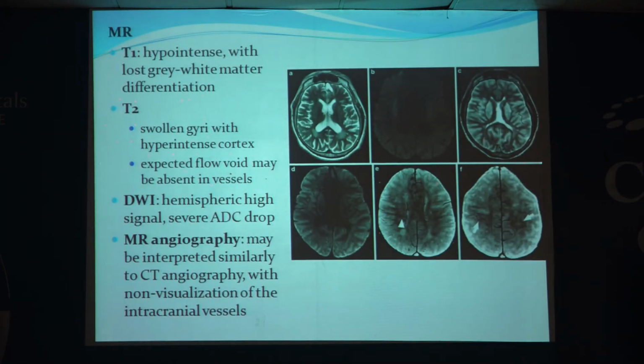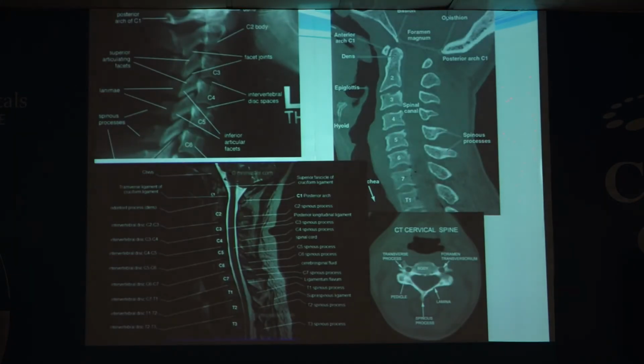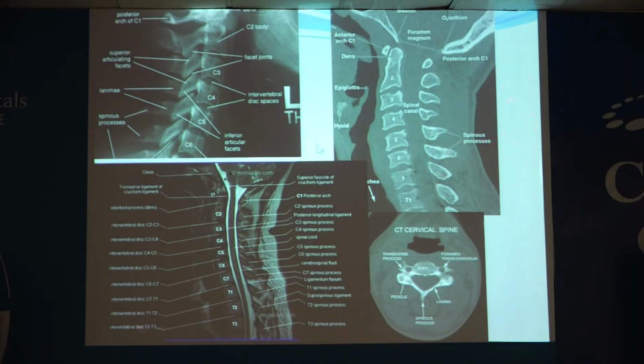Now, that is in short about a little bit of brain imaging. Now, coming to the neck imaging. Neck will have soft tissues and a cervical cord. So, this is a sagittal MR imaging showing a cervical cord and a good amount of CSF surrounding the cord in the thecal sac. Anteriorly, we see the vertebral bodies, and posteriorly the spinous processes.